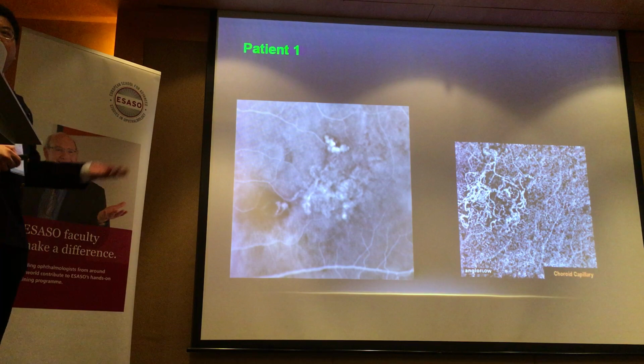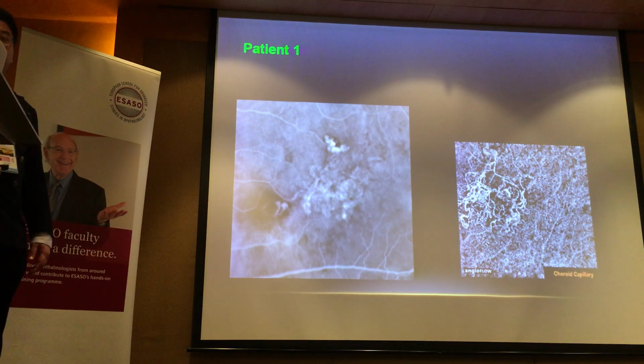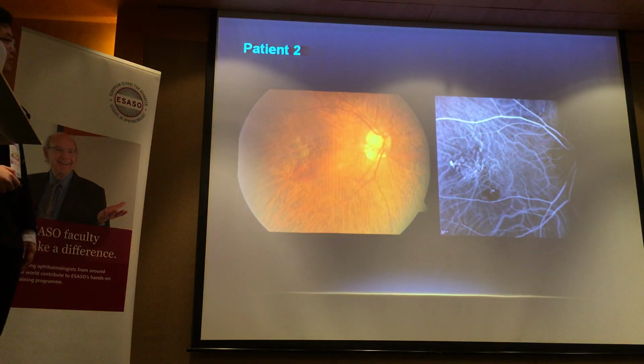And so you're probably thinking, oh, what are you talking about? I can see the polyps there. First of all, I know it's a bit cut off, but perhaps there could be another lesion here, which is not so well seen on the OCT-A. But let's look at this other patient.